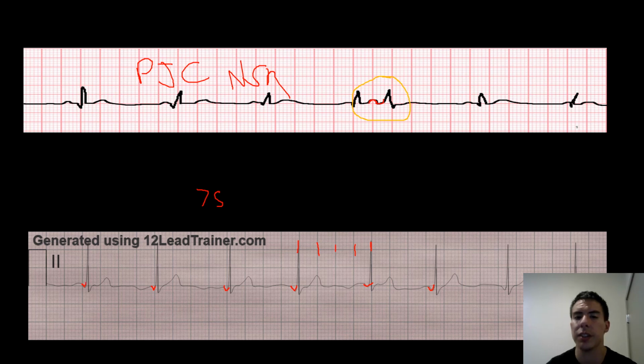It's just different than most QRS complexes, the Q wave going into the R wave would be. So I'll call it an inverted P wave, but even if not, then we just say there isn't one, and still the same result. So inverted P waves or no P waves.